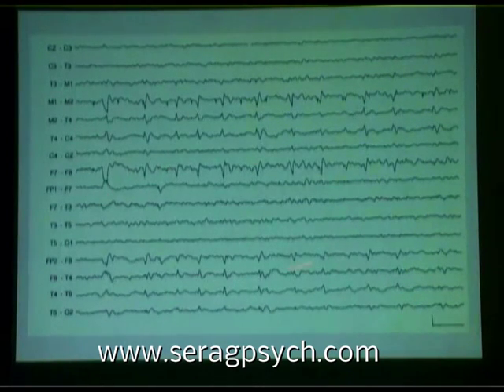And again, this is an unusual number of spikes, of course. Usually you go a long ways in the EEG before you see this. But I emphasize that this montage is a very useful montage, this coronal run here. Even here, F7, F8 is not bad. As you can see, F8 here being much more involved than F7. So there's value in even that. So this is a good montage.